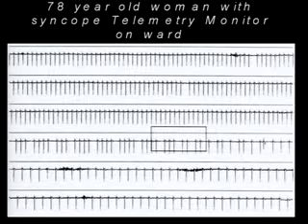So this person ends up with sinus bradycardia at a rate in the 30s, and it's really 2 to 1 sinoatrial block. If you just saw that bottom strip, you would never know, without all the other information, that that is 2 to 1 sinoatrial block. But when you see this whole progression, you can be very convinced that this is sinoatrial block.